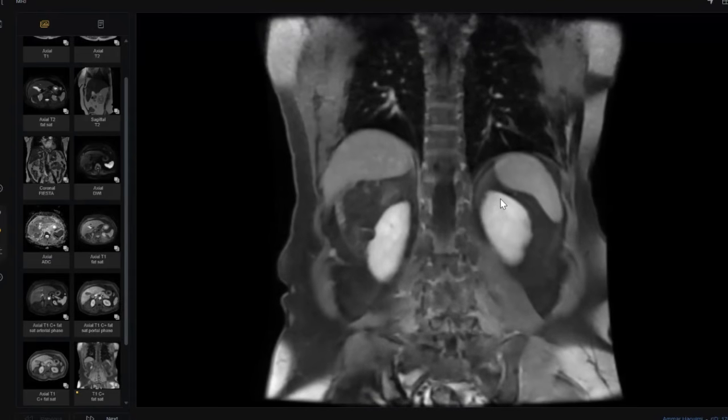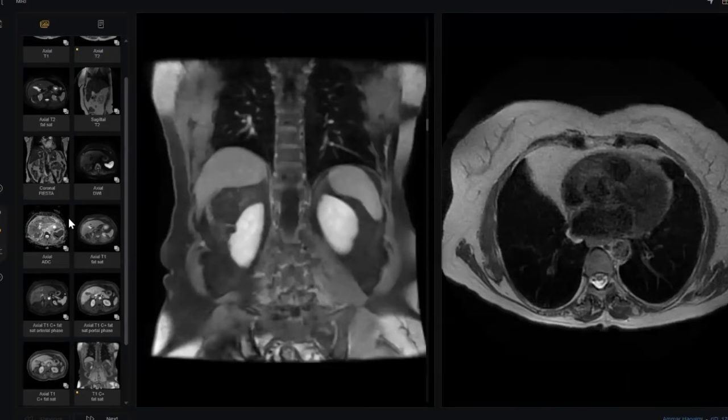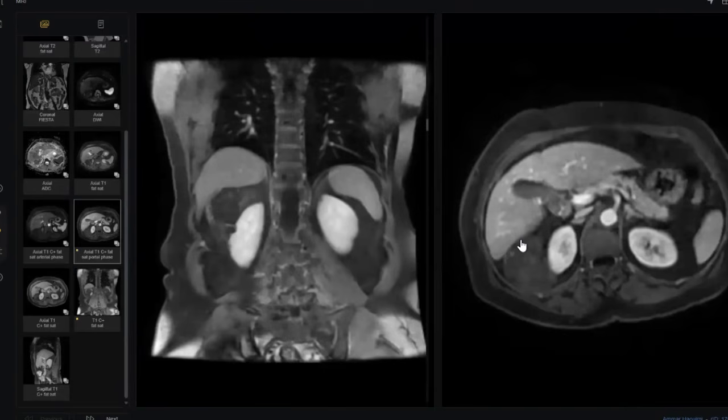By the way, I can't appreciate any other lesion; this is the only lesion in the whole exam. Okay, sir, I think this is angiomyolipoma because I can see infiltration into the renal parenchyma. Why? I'm so worried. I'm the clinician, and I suspect, sir, it is a liposarcoma. I insist. I look at the images.